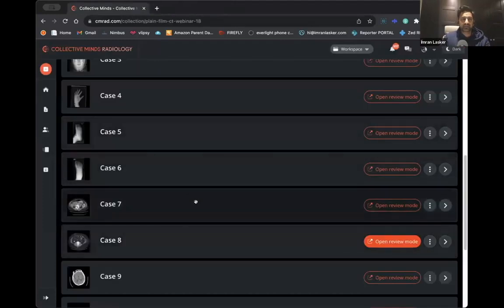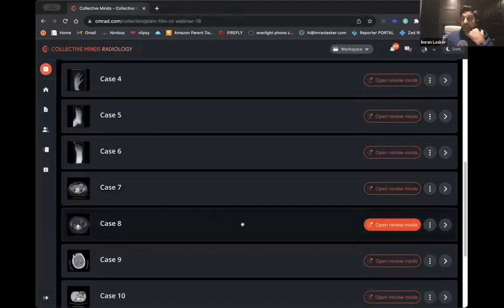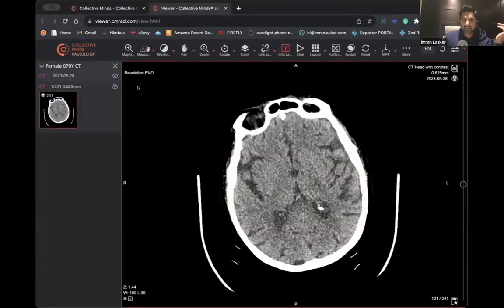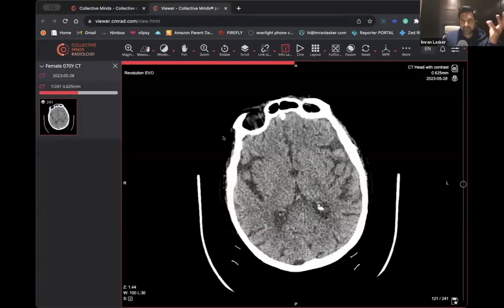Have a look. It's quite an interesting little thing that can happen. I've seen these, right? We've had post-surgical patients with this collection, and they keep following up, and the collection is just not disappearing, because it's a collection, but it's not a collection at the same time. It's not quite the same. There's no perforation like that. It's infarcted fat as a result of someone going in and nipping a vessel, or vascular pathology in general.